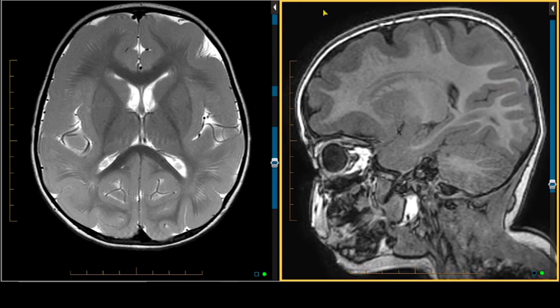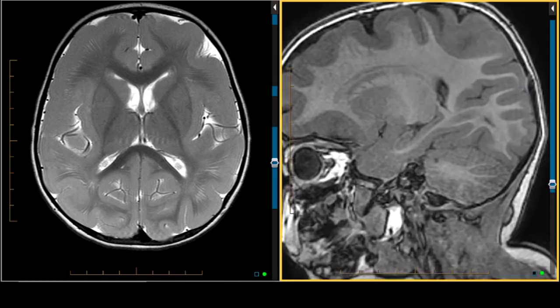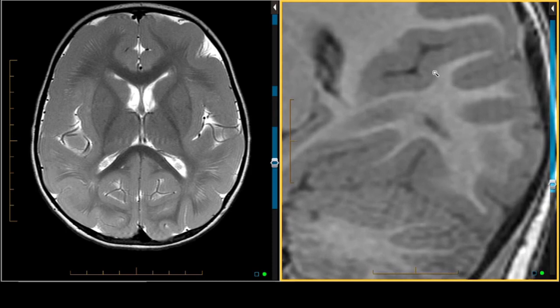Now, the one thing that we can see well on the T1 weighted image is the nice gray matter, and beneath that we see the white matter. There's no band-type heterotopia. So this is a diffuse mild lissencephaly spectrum disorder involving both cerebral hemispheres, anterior and posteriorly, without band-type heterotopia.